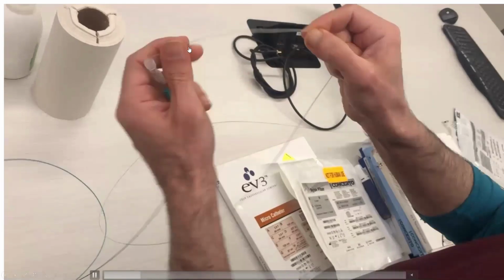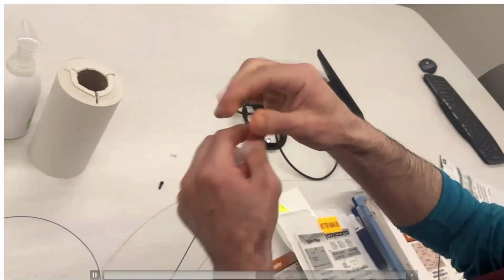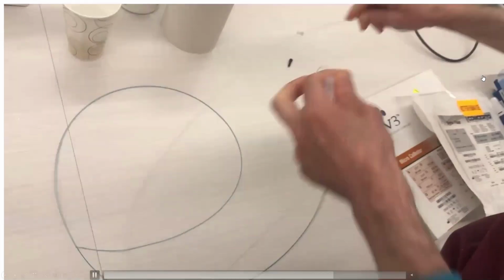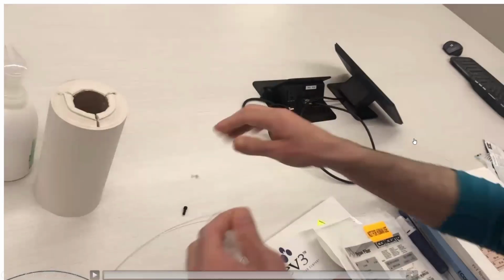And here you may see the plastic introducer, and inside it you see the coils, and those coils are attached all the way to a wire that goes all the way out. The introducer white sheath finishes somewhere here, whereas the wire is much longer at the back.